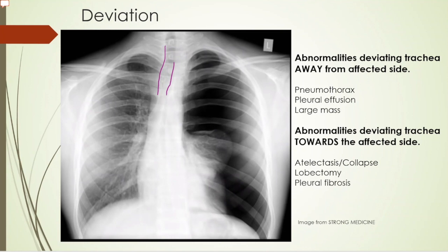In this patient here, you can see they have a tension pneumothorax. Well, let's go through the systematic approach here. So we did A. We see that the trachea is deviated somewhat. It looks like that's probably the carina right there. B, look at the bones. They're all fine. C, cardiac silhouette. And you can see the silhouette here is pulled or pushed towards the patient's right-hand side.